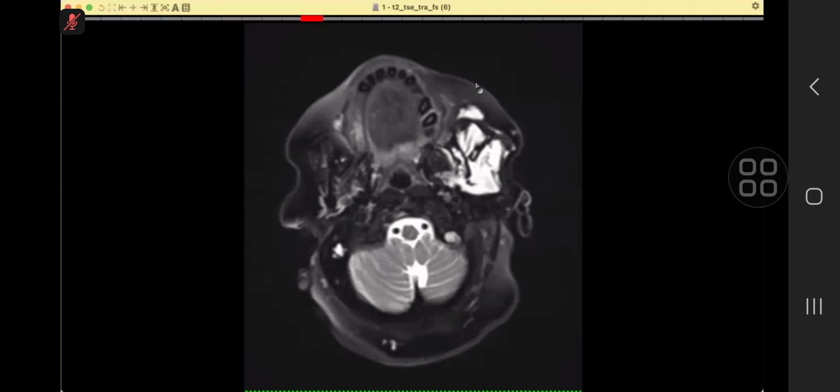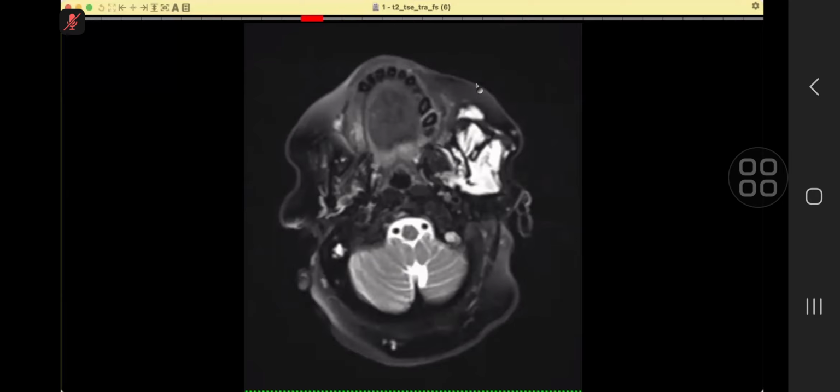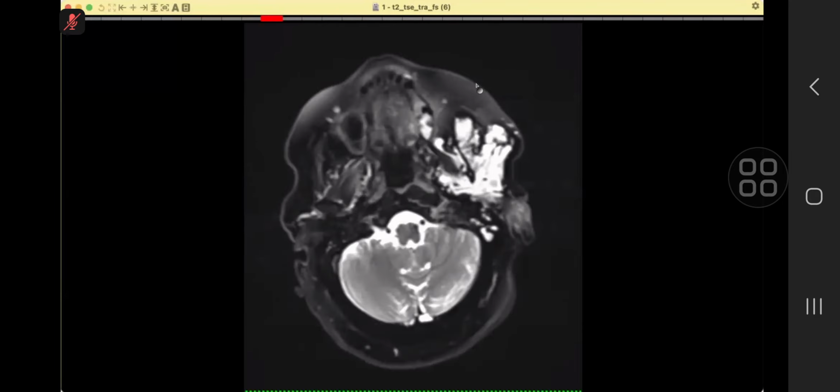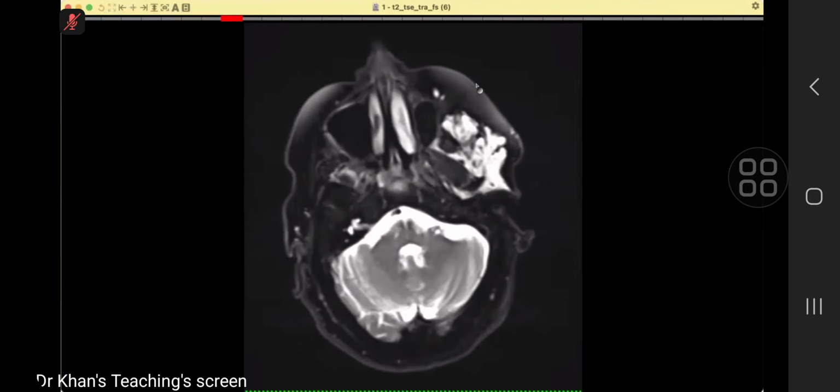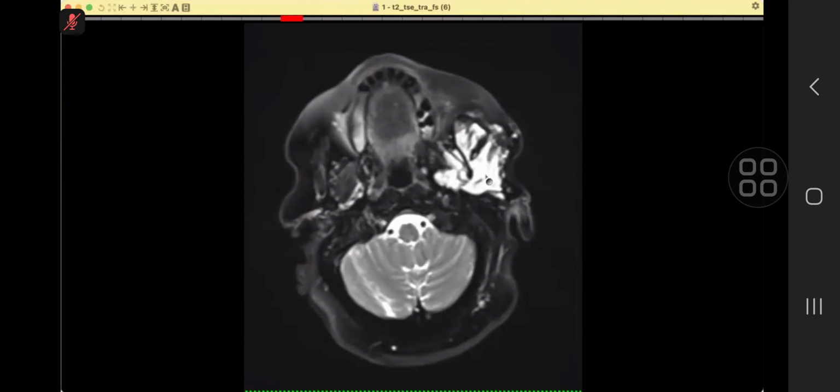Bone is also... Show me the pterygoid muscle. Sorry. Show me. You have said that they are not invaded, they are surrounded by it. Sir, at this area? Okay, just hold on, please. What is happening here? Sir, these muscles look invaded and this bone looks invaded as well. What is this bone? Name the bone, name the muscles. It is medial pterygoid and it is maxilla.